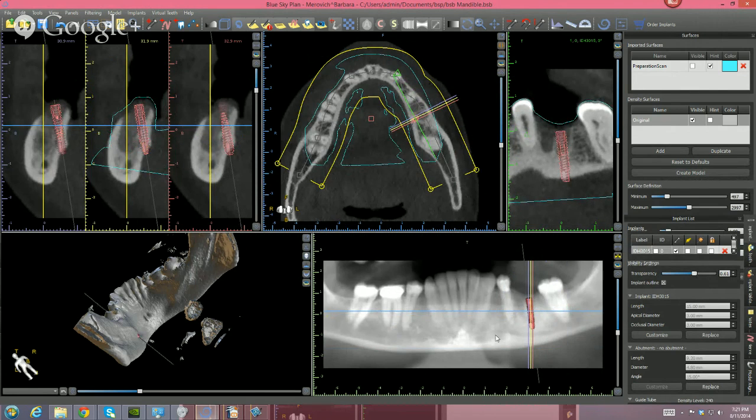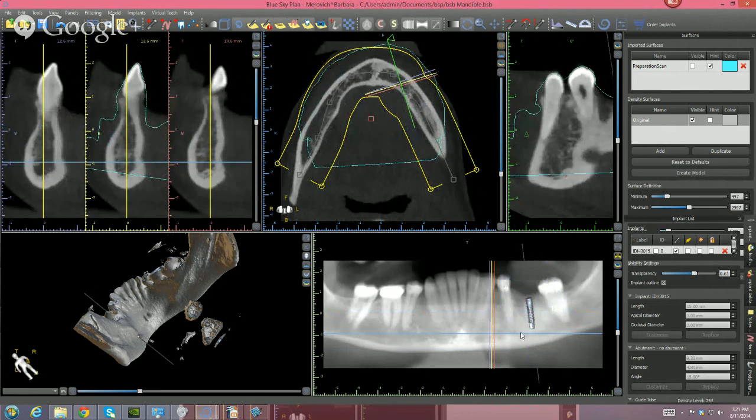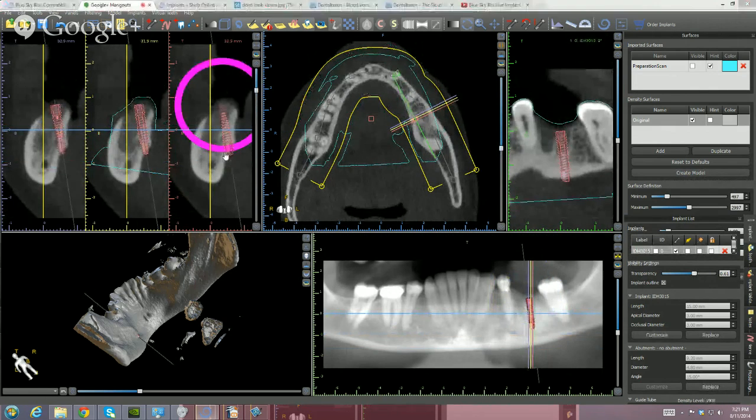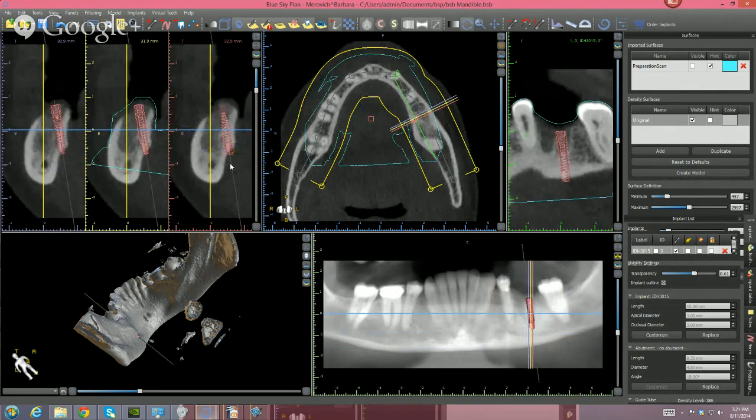Here is an implant. Like I said, it looks great. The canal is running over here, but in reality, our implant is in the submandibular fossa. And if there's a blood vessel that happens to be up here, it's not common, but it can be up here. Then you have, is it life-threatening?